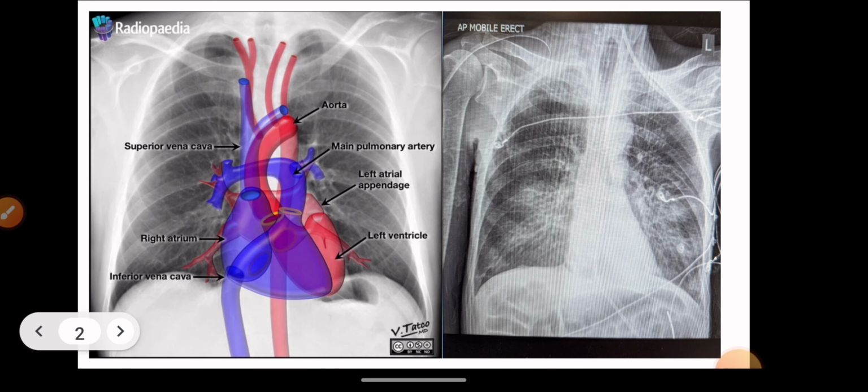So a version of what I use here to teach some of the anatomy is just a simple way of marking out where all the regular anatomy and blood vessels are. So in the middle is the heart. You've got the main places where blood vessels enter in, called the hilum, and then those blood vessels radiate out from there. So often if somebody has very prominent hilum and blood vessels radiating out from there, I would refer to that as a vascular opacity.